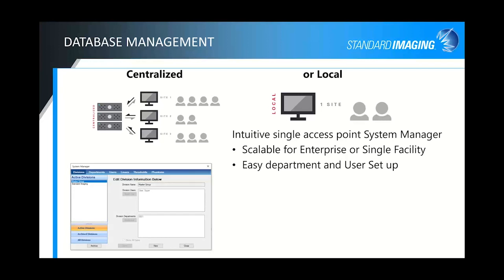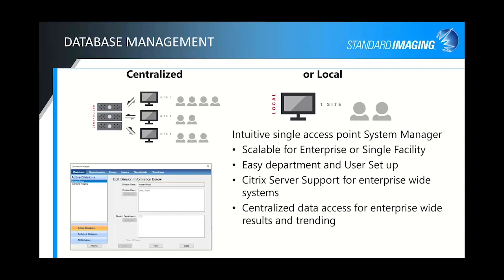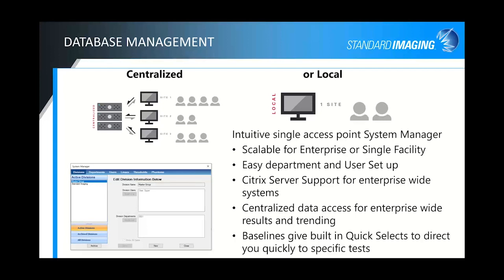It's got a very easy department and user setup. You can see our system manager dialog box on the left, breaking things down into divisions and departments and users, various linacs, setting the thresholds and the phantoms. We have Citrix server support for enterprise-wide systems. There's centralized database access for enterprise-wide systems as well for checking your results and your trending and comparing. And setup baselines gives you built-in quick selects to direct you to your specific tests.